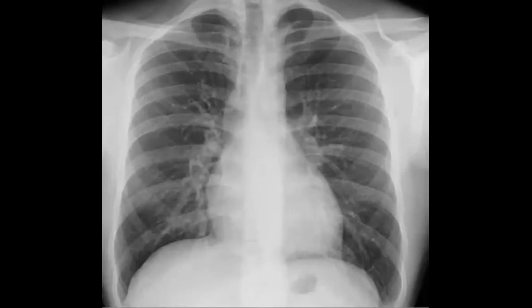Now time for some short cases and rapids. Maybe just colonic fecal loading. Yes. Okay.